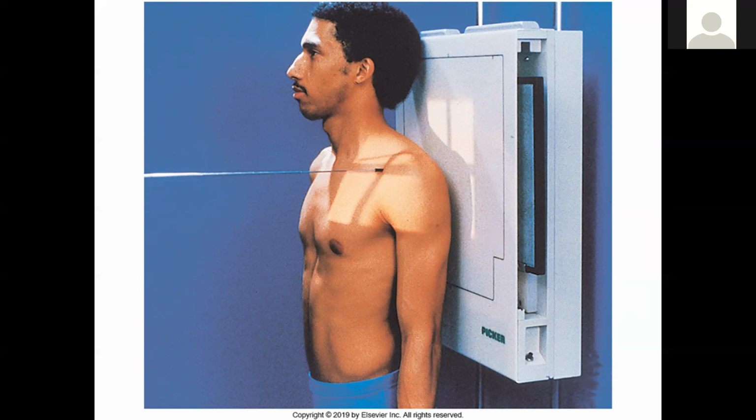All in all, clavicle, routine exam, especially for kids who have fallen. It's fairly easy with just 2 projections, and your patient doesn't have to move. Just the tube and bucky need to be adjusted.